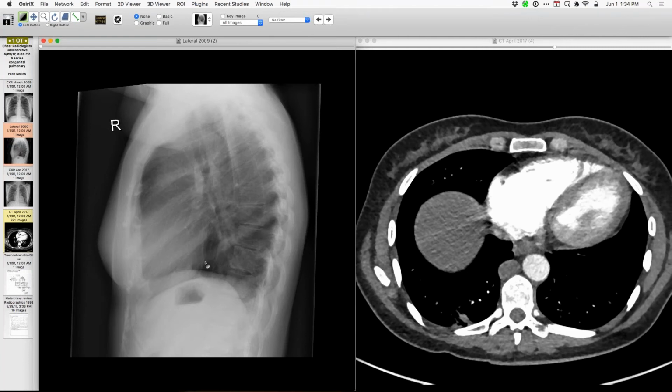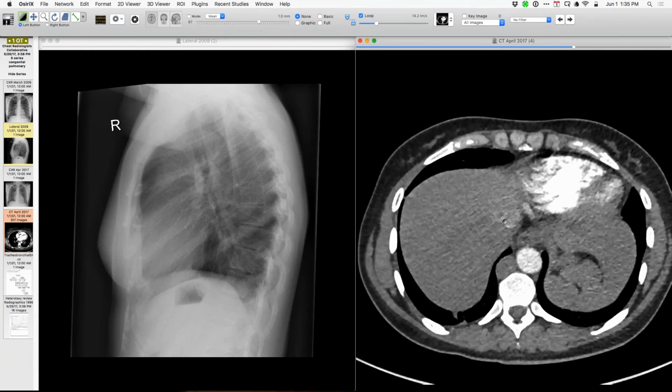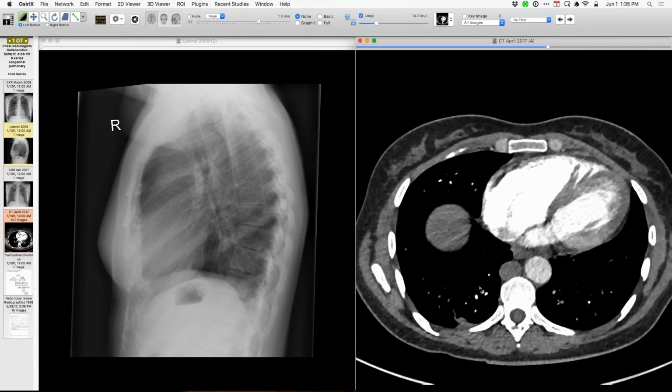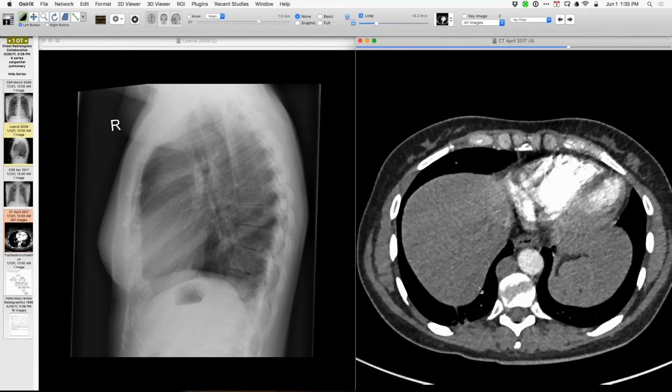Okay. So yeah, David, that's a great observation. If you think that might be going on, you look for the IVC up here, you don't see it, and it's an additional point. Great. Well, the thing is, we do see it, but people said we shouldn't be seeing it, and therefore we're not seeing it even when it was there, as in this case. So you do have it in this case. It's a little anterior to your arrow, and that's because the suprahepatic inferior vena cava is still present. That's what generates the interruption is below it. Yes. So that's still going to be visible on lateral view, but they misunderstood where the cava is absent, and they said we shouldn't be seeing this contour that we see, and therefore we're not seeing it.